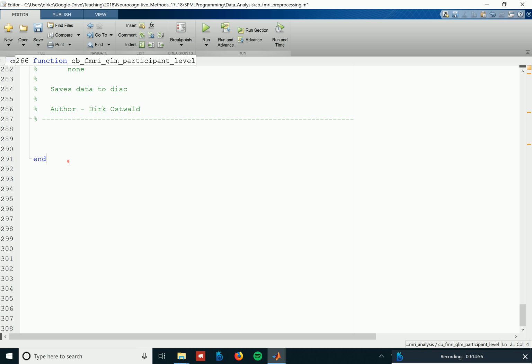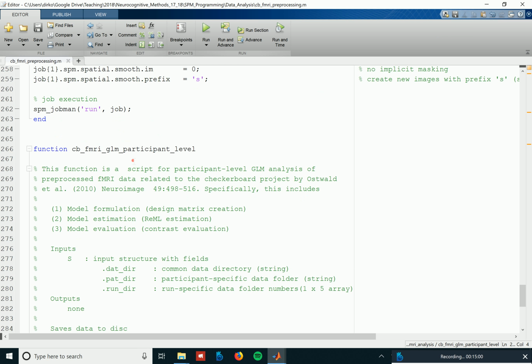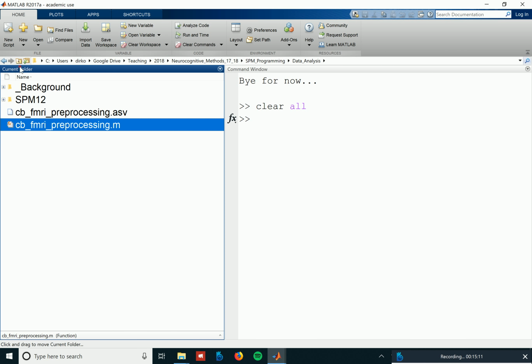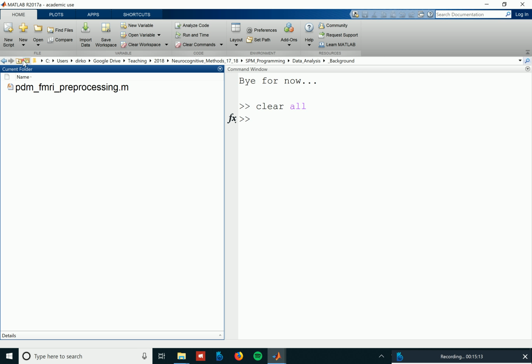The other people are not here, so they really don't care. So good, then let's do this by script. Although that might be harder than I thought, but of course we have an old script. We only have this one.